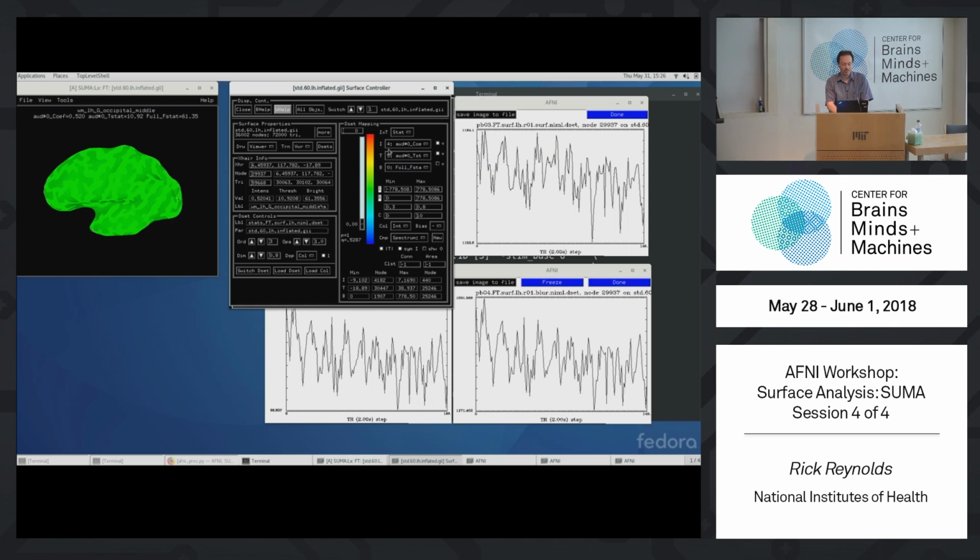And note, just like in AFNI, this is a selector box, a drop-down with one of the little rectangles on the right. That's one of the cases where you can right-click the text on the left of the box and get a different type of menu if that's better for some reason, if you have a lot of indices to work through.